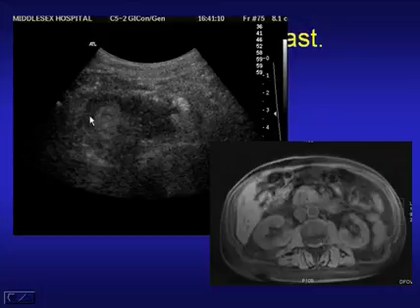This is the mucosa of the duodenum. You can see the layered pattern, which is enhanced normally. And this is poorly enhancing tumor invading the muscularis propria of the duodenum in almost a circumferential pattern. So we're seeing that really well, both anteriorly and posterior to the tumor.